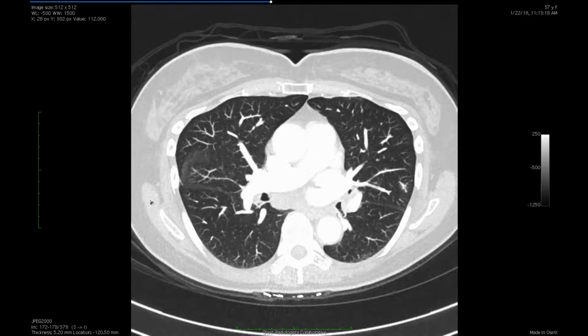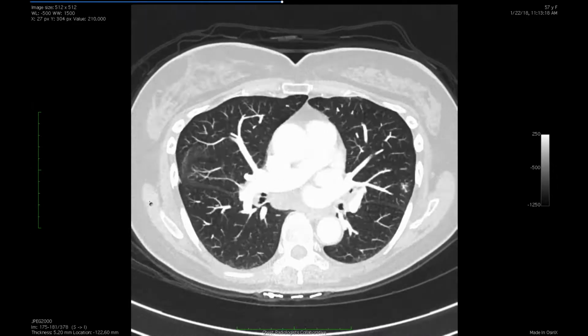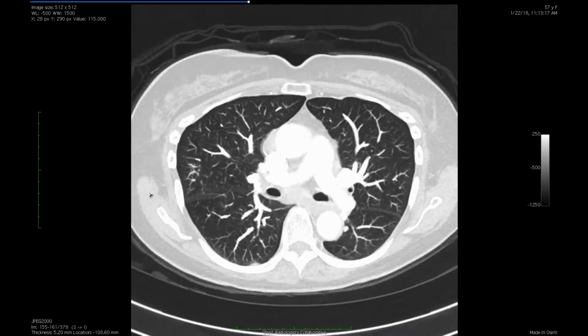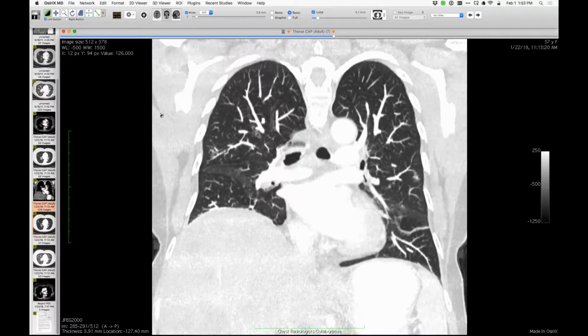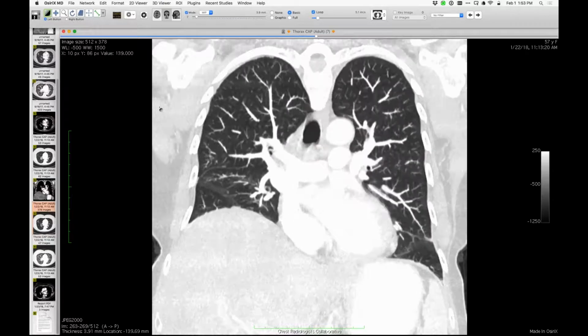So I think there's a good chance that this metastasized from her liver, because hepatocellular carcinoma also likes to do this. These are tumors with easy access to veins. Like renal likes to go into renal veins, and hepatocellular can go into the hepatic veins and get back. And so can adrenal. I've seen adrenal cancers do this. So I think maybe the colon cancer got to the lungs via the liver.